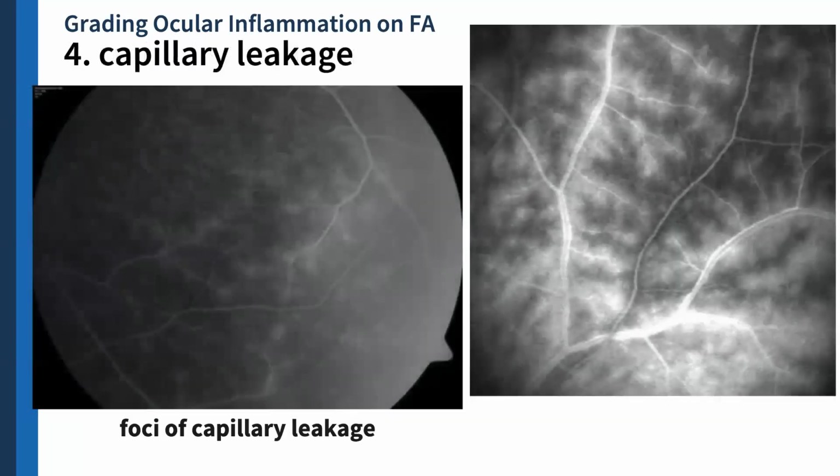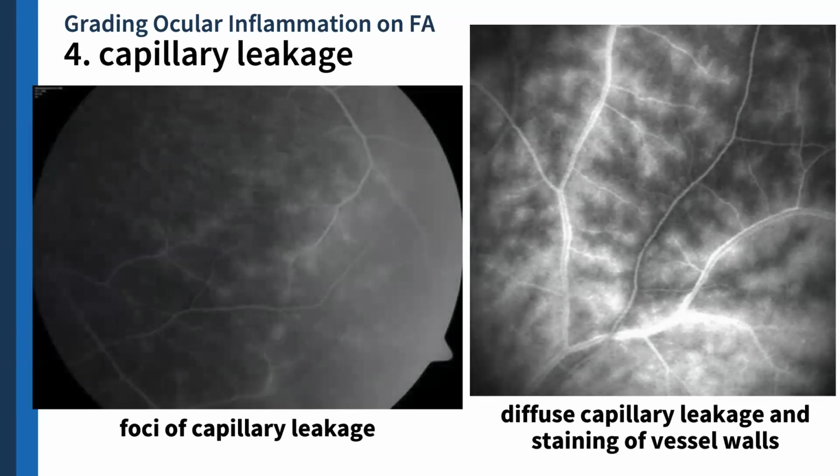But there, so you can have, like kanina, you saw na parang all of the retinal capillaries are inflamed, so that's diffuse capillary leakage. You can also have leakage just in small areas. Perhaps you guys have seen angiograms like that, na parang there's just a few areas na nagli-leak. And the buzzword that we typically look for here is you typically note the fern-like pattern.